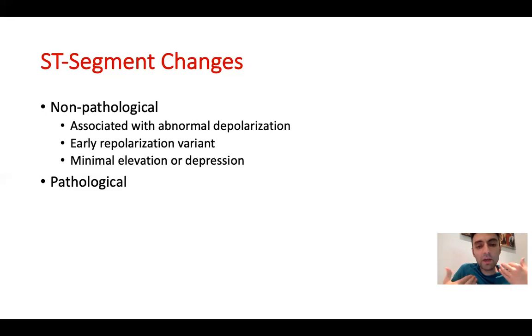For example, if you have a patient who underwent tetralogy repair and has right bundle branch block, oftentimes you will see ST segment changes within the right bundle branch because of the block, but you cannot assess whether this patient is having acute ischemia.